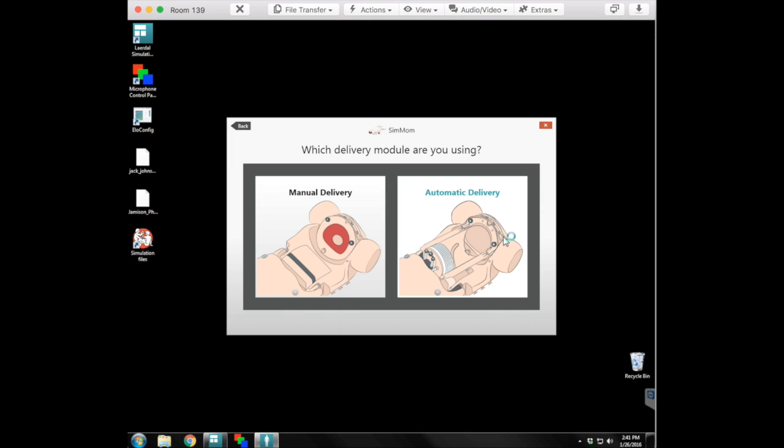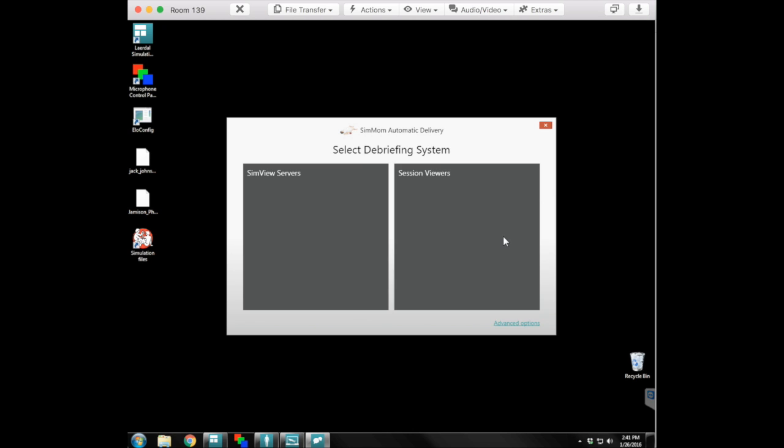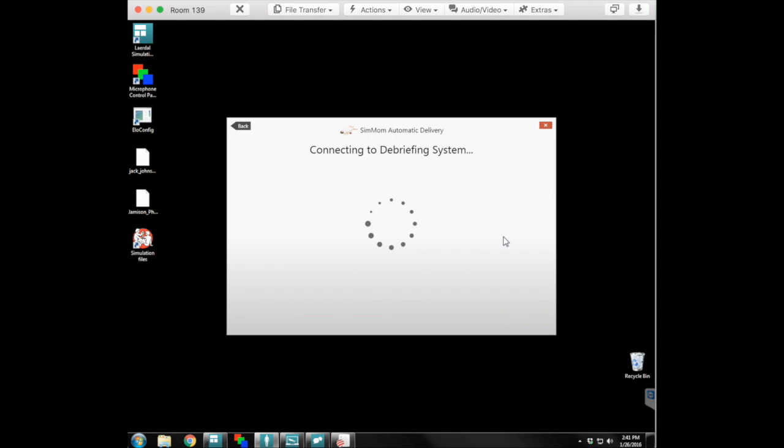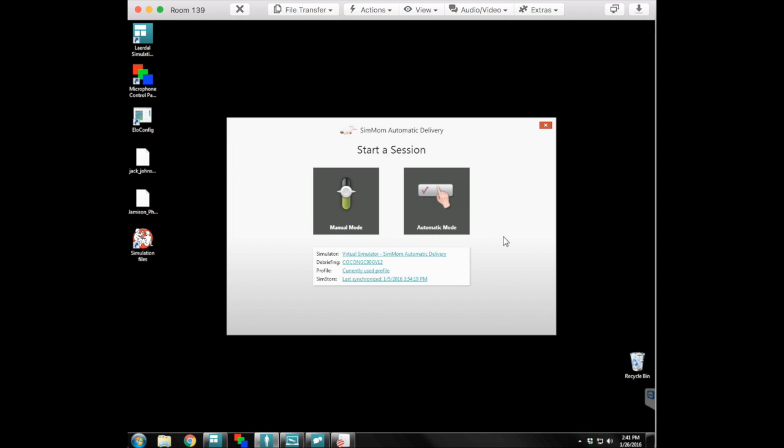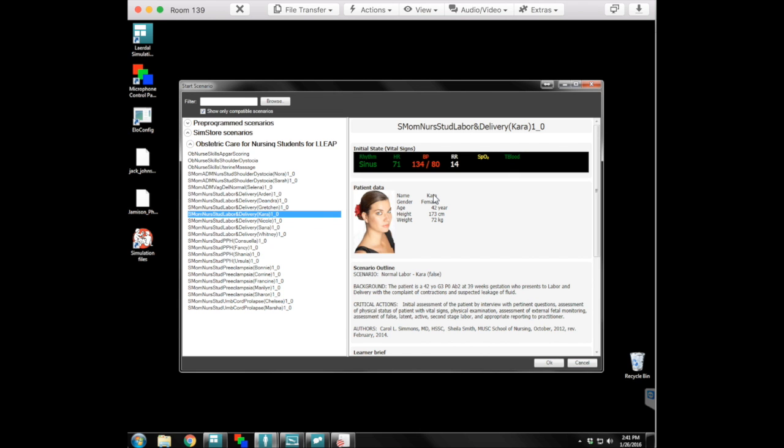So I'm going to choose automatic delivery. Great, and we always run from automatic mode. Click on automatic, and here we are.